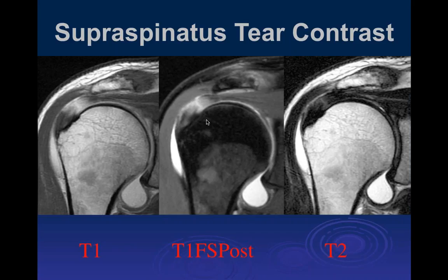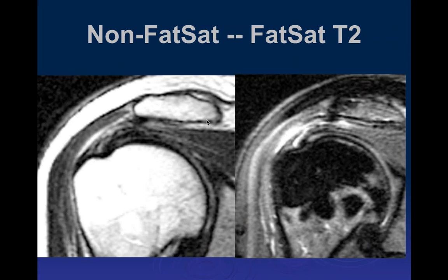You see degenerative changes as you go towards the supraspinatus muscle, and so I suspect that this is probably correct. But I think this is a case that I probably would exercise and redo the MR before I would think about surgery. Yep. Good. Anyway, thanks, John. Thank you.